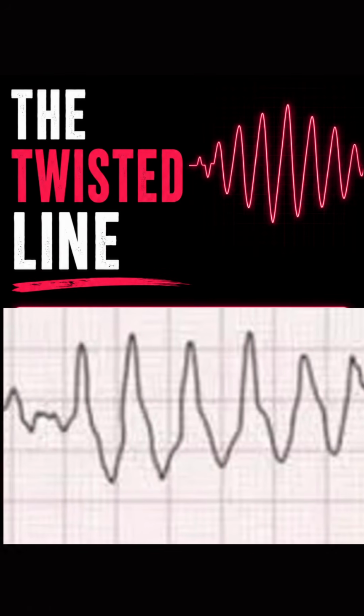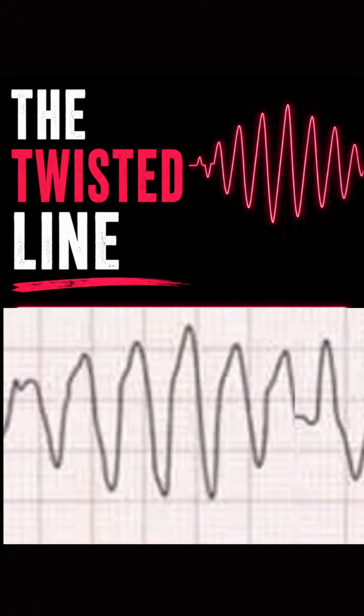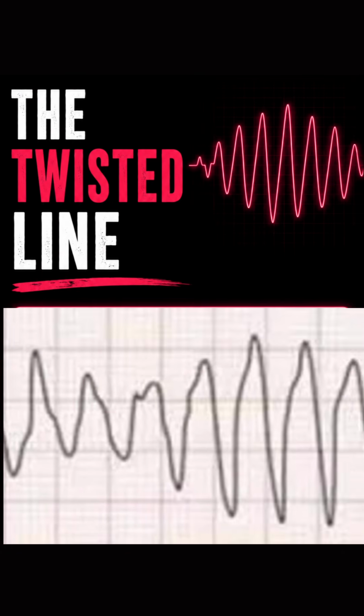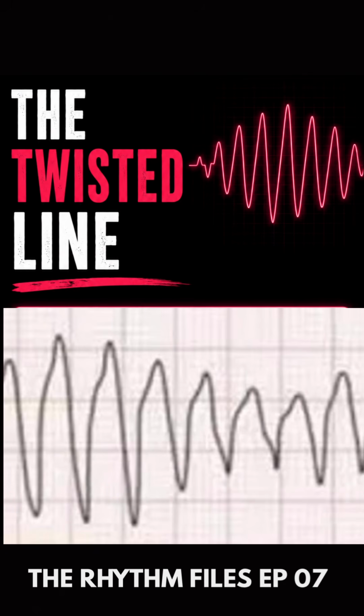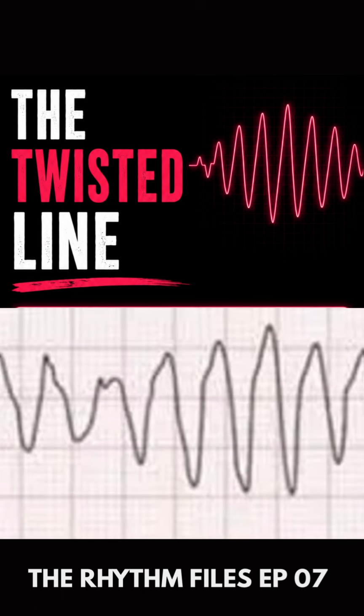This twisted line that you can see on the ECG strip is an unpredictable rhythm and is deadly if not treated properly. This rhythm is a polymorphic ventricular tachycardia known as torsades de pointes. So let's understand the basic mechanism behind it.